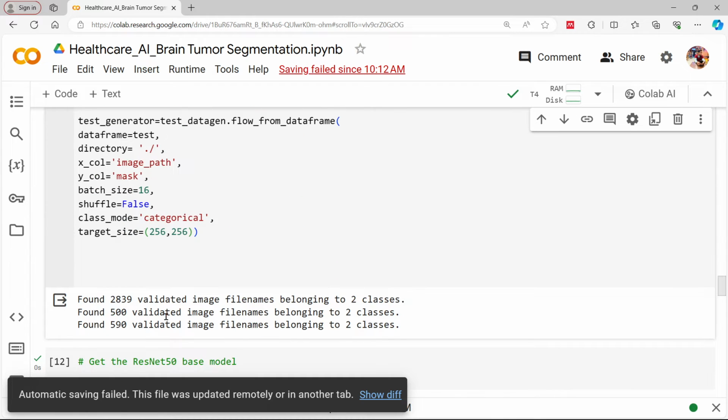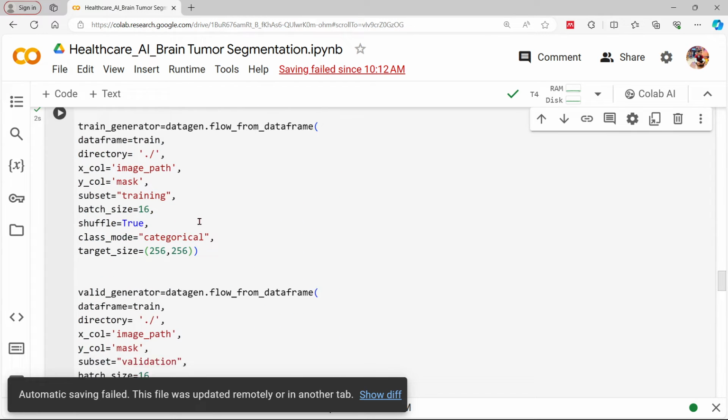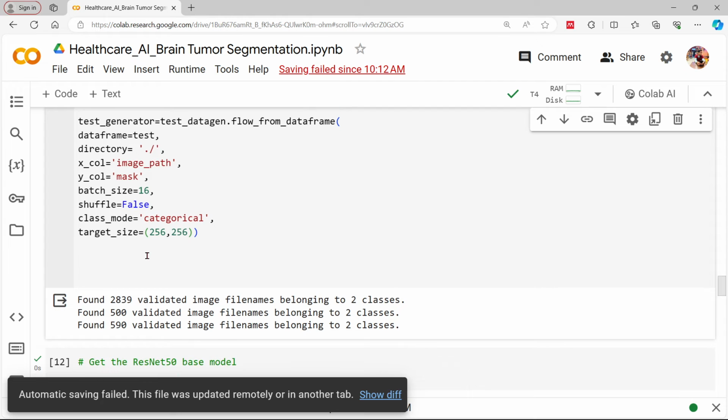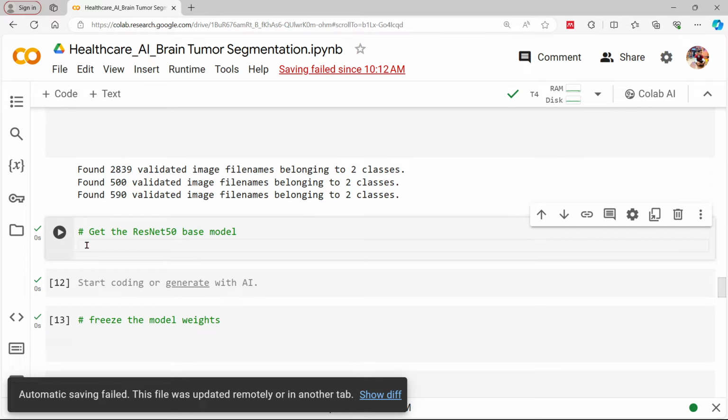Can you see? Entire files, every folder, all the images are segregated into three portions. First one is the validation, and then training, testing, and validation part, right? So you can connect the dots here that we are dividing each value, and then we are going to create the training, validation, and testing folders here, right?